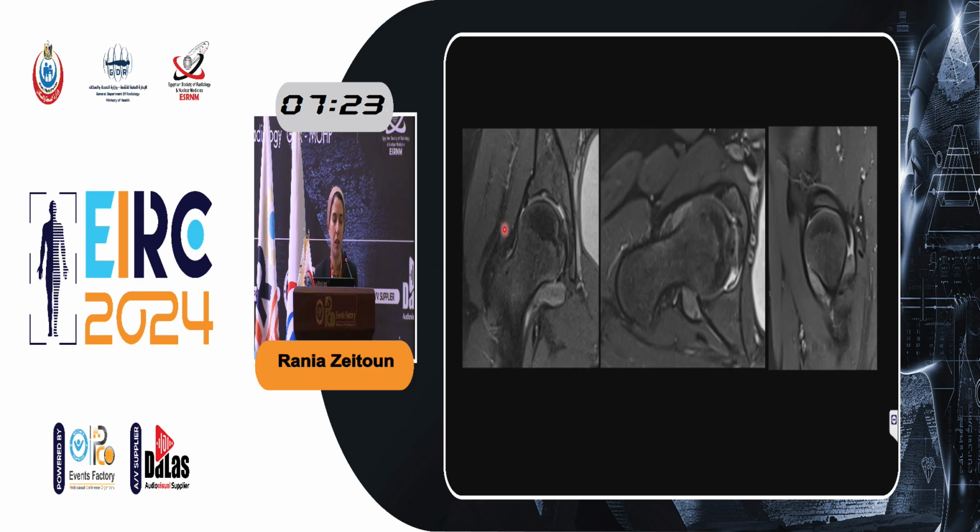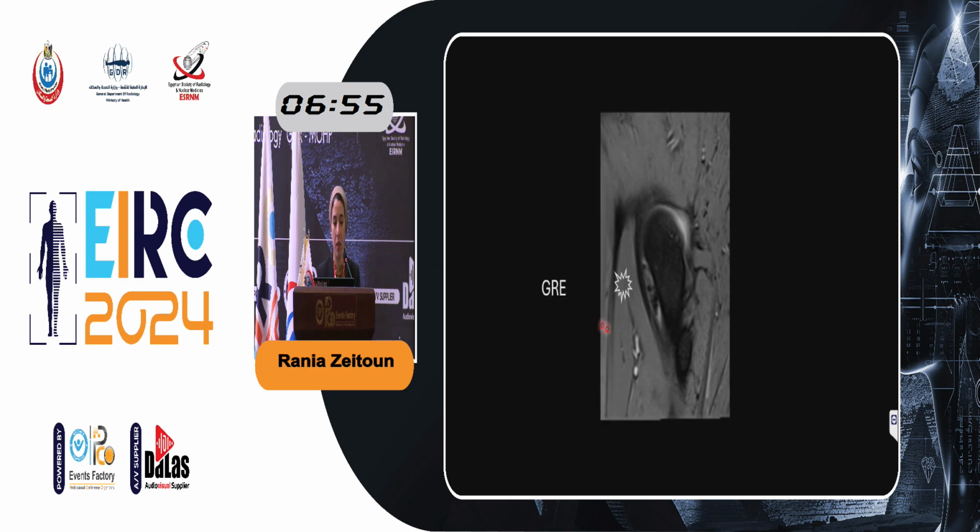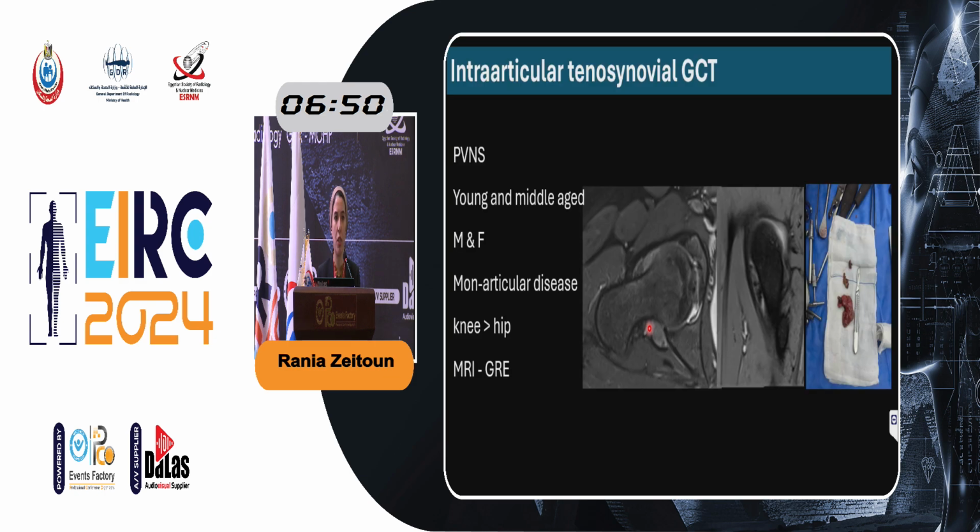And this is the opposite scenario, where the patient was already under the care of a rheumatologist for many months, and then he was not satisfied, and he realized that the patient is not responding well to his management, to his medications. So he ordered an MRI and referred her to orthopedics. High-resolution MRI shows synovial proliferation, and this is much more than just synovial thickening. It is mass-like changes, and we added gradient echo images, which beautifully showed the blooming artifact and signal drop from the hemosiderin, which is characteristic for cases of PVNS, or the new pathological term, tenosynovial giant cell tumor.